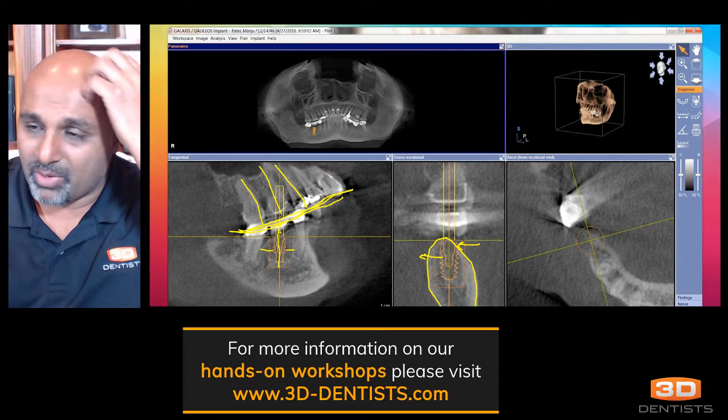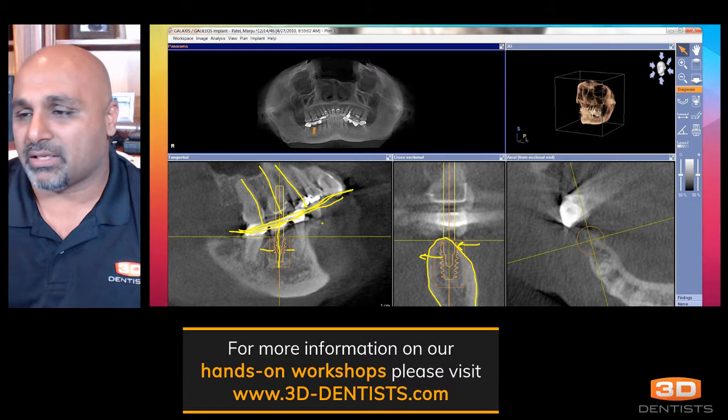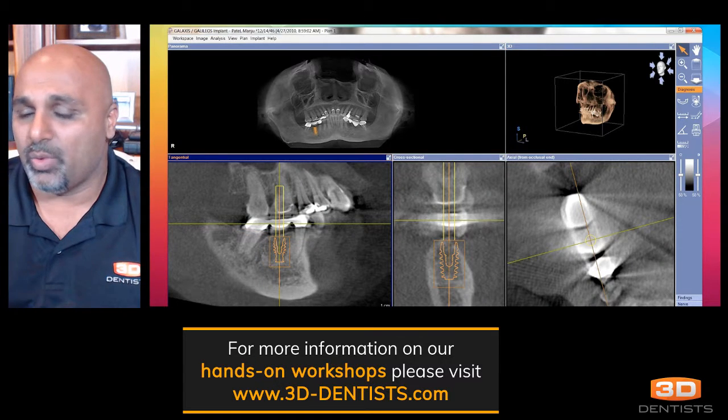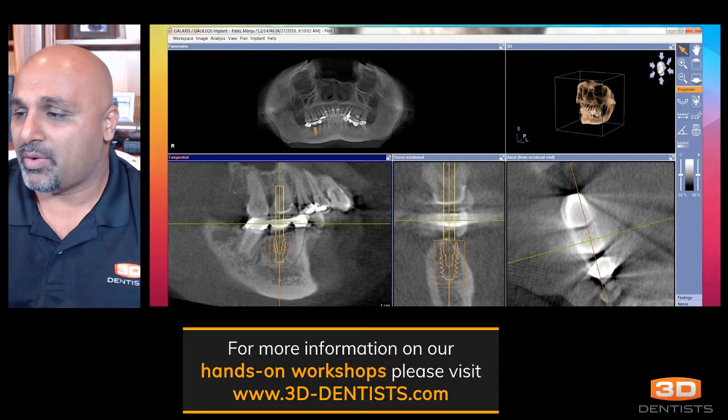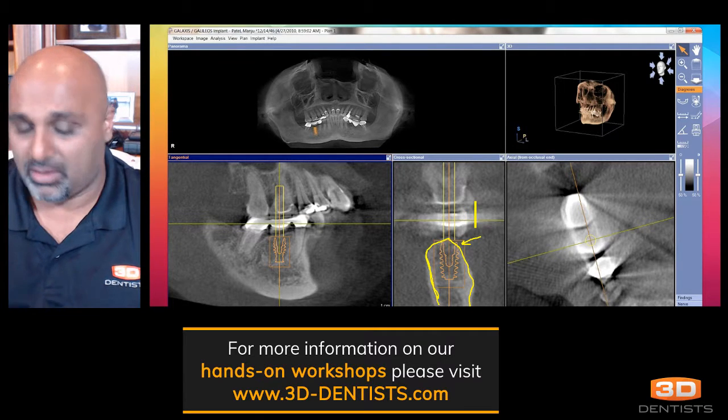And really what I take issue with is that with all this technology, why would we allow ourselves to have a not perfect result? And so with a little bit of tweaking, we can get a plan that looks somewhat like this. Now again, still in this situation, our implant is just outside of the bone here on the buccal. Now that will be grafted. Okay.